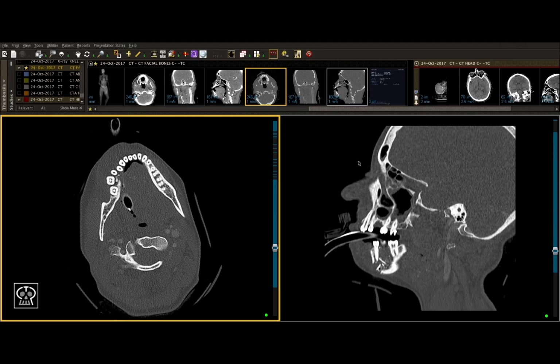That concludes our final example of a mandibular fracture. The main message is that no matter how complex your fractures may be on the CT scan, it's important to take them one by one and follow the same protocol to make sure you don't miss any other fractures.